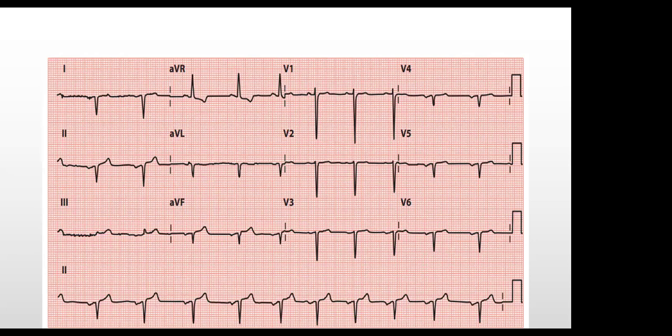Because you have dextrocardia, there is basically no contractile activity from the lateral leads. You get my point? So either way you look at it is correct, whether from the perspective of poor R wave progression or low voltages.